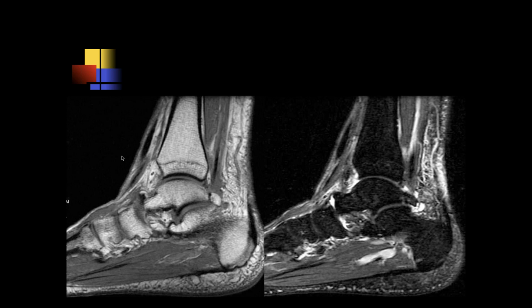Okay, Ashu. Looking at this prominent os trigonum here, and then there is a lot of spurring at the talonavicular joint as well, and there's fluid there. Yeah, talar beaking. This is that spur that you can get, just like you said, at the capsular origin there on the talus, and it's often called talar beaking when you get this, just a chronic traction injury and osteophyte formation in that location. Jennifer.